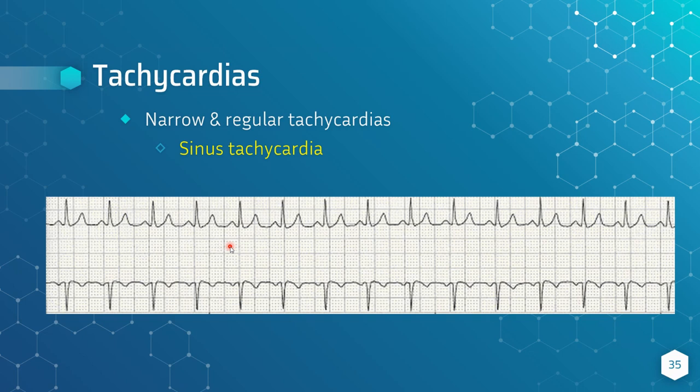And that's very meaningful because if you have an 80-year-old in the hospital, for example, and their heart rate just jumps up into the 180s and they're 80 years old, well, you know that heart rhythm can't be sinus tach. It has to be something else. But obviously, there's also other exceptions, but that's usually the main guideline when you're looking at that.